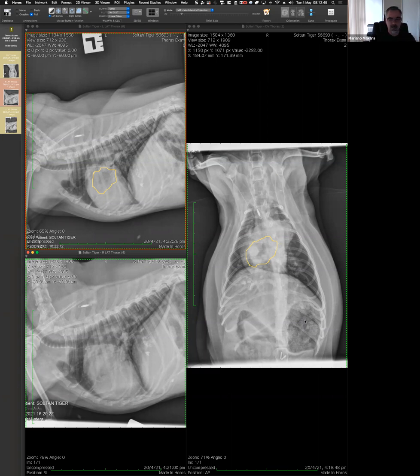Is that correct? I think we are not certain what it is, so it's hard to define it. So I take note, and then we come back and we try to undo this slowly.